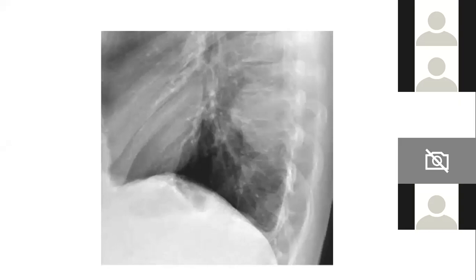Definitely. You can say this is more likely in the middle or posterior mediastinum and ask for a lateral view. There is no problem at all. You have to ask for a lateral view, and you are right. New guidelines on CT, sure, you have to use them. That's not at all a problem. And these are basically being described on a chest X-ray. When it comes to CT, we'll discuss that, maybe not in this class. ITMIG is not that popular still.